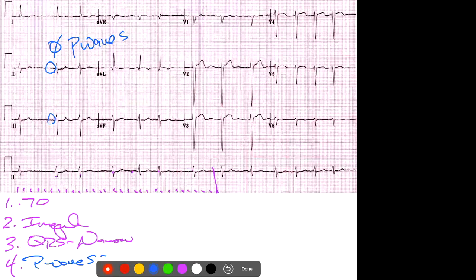You can try to make it one. It is not a P wave. It is this other type of wave that's going to hit right before the QRS complex. Sometimes it's going to make you think that. Do you see it anywhere else? And the answer to that is no, right? It's the irregularity in this baseline that's causing them. There are no P waves.